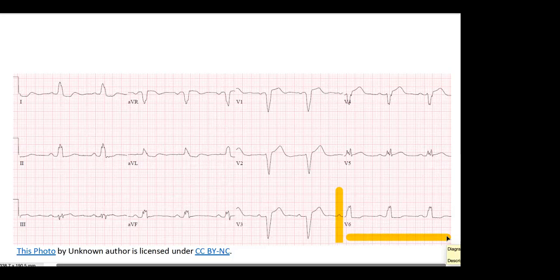No. No means it's a sinus rhythm or it's not? It's not a sinus rhythm. Why? The QRS, it's abnormal. Somebody else? It is a sinus, although I've been shown only 2 QRS, but all the 2 had a preceding P wave. I'm not sure, I think that was just a delayed or slowed. Right, and I don't know what your name is, but you're right.